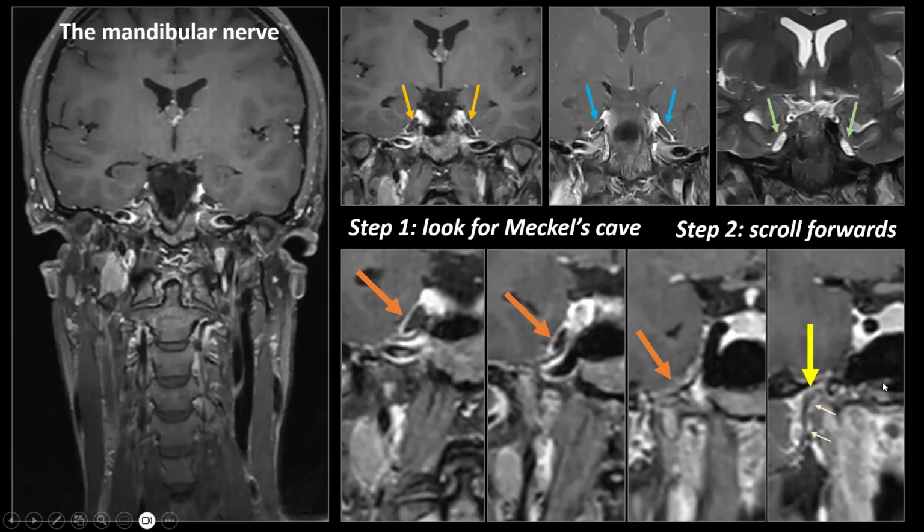So try it out. Of course, you can't always easily see it. It all depends a bit on your slice thickness and so on, but just try it out. It's always fun to discover the mandibular nerve.